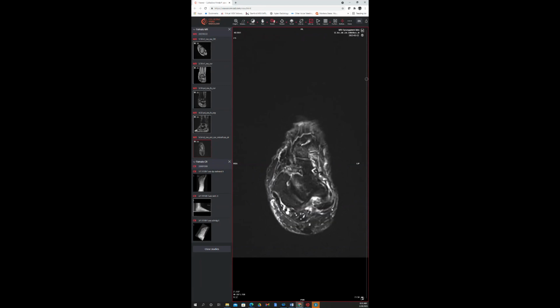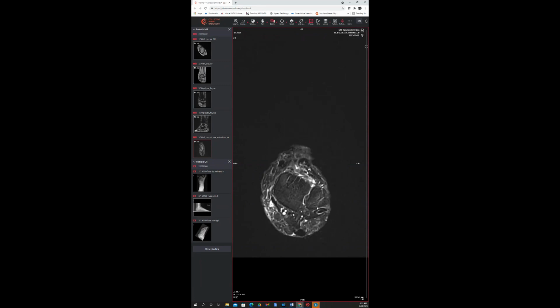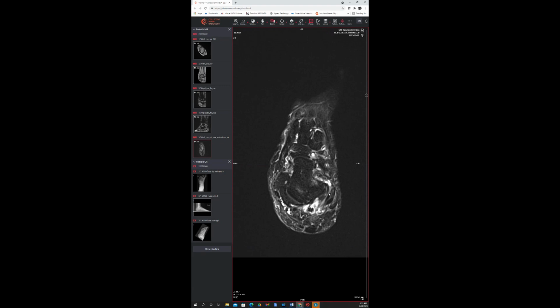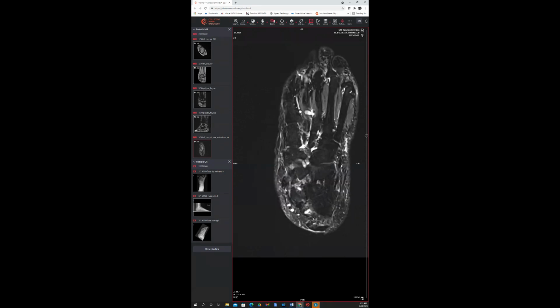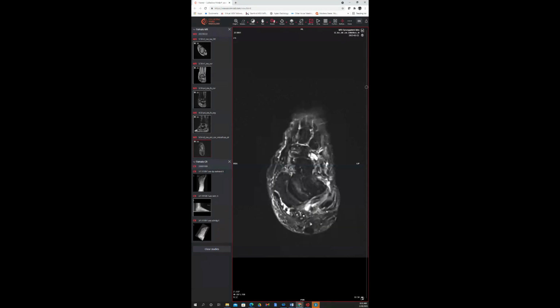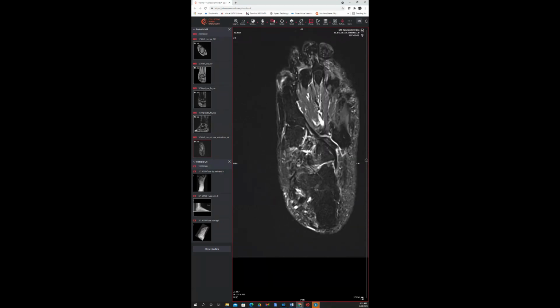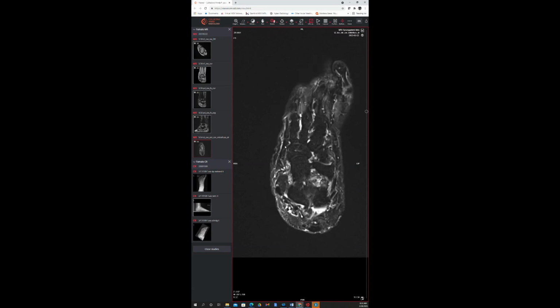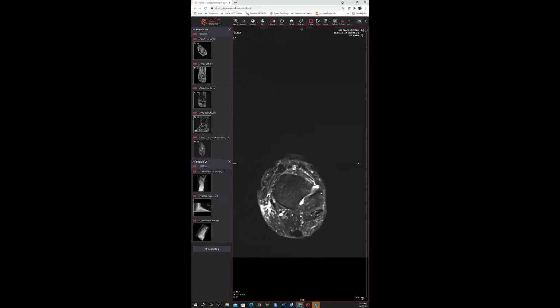The lateral tendons, we're looking at the brevis and the longus, and the brevis we can see spreads out and becomes tendinopathic, split tear, rejoining to form a common tendon intact to the base of the fifth, very common in pes cavus pathology. Longus being intact, going along the pulley of the cuboid tunnel. Moving up to the extensors, a little bit of tibialis anterior tenosynovitis.